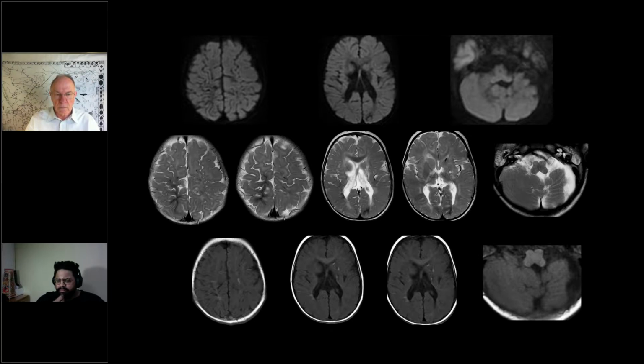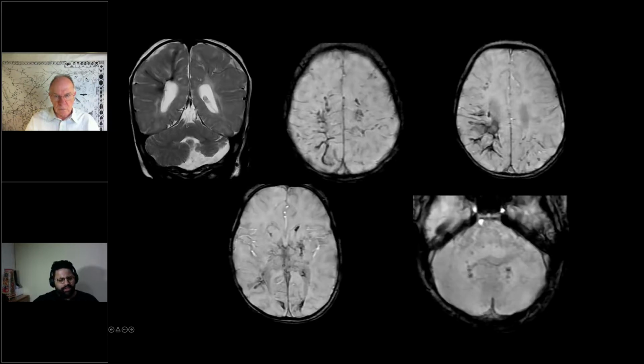I haven't done any tests in this baby. Families, so I wanted to just have one go, because I know I won't have many chances with them. And the cerebellar atrophy, cerebellar diaschisis, on the left side is probably related to an injury, given the hemosiderin deposits. So that's why it will be odd for Aicardi.